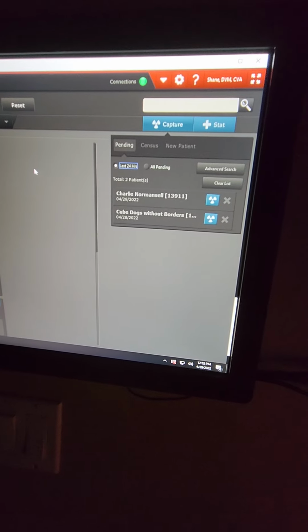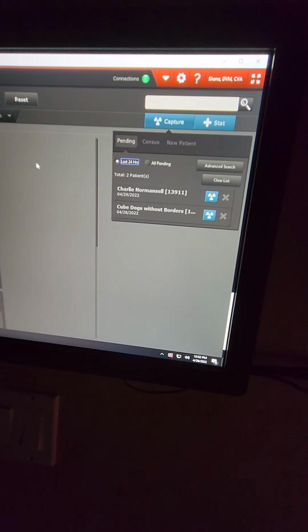Okay? So do you not have to change that anymore? You do. You still have to. What's the point of changing it here then? It's just another way of looking at the technique chart, I guess. Do you not have to change it here? No. Okay. You don't have to.